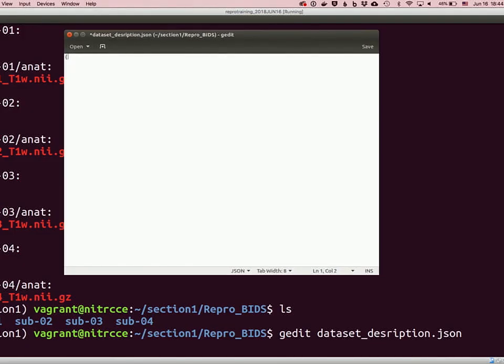Now, I have to make this window bigger? I don't know if I can make this window bigger. It doesn't want to. Control plus on this? No, not the other window. It does.